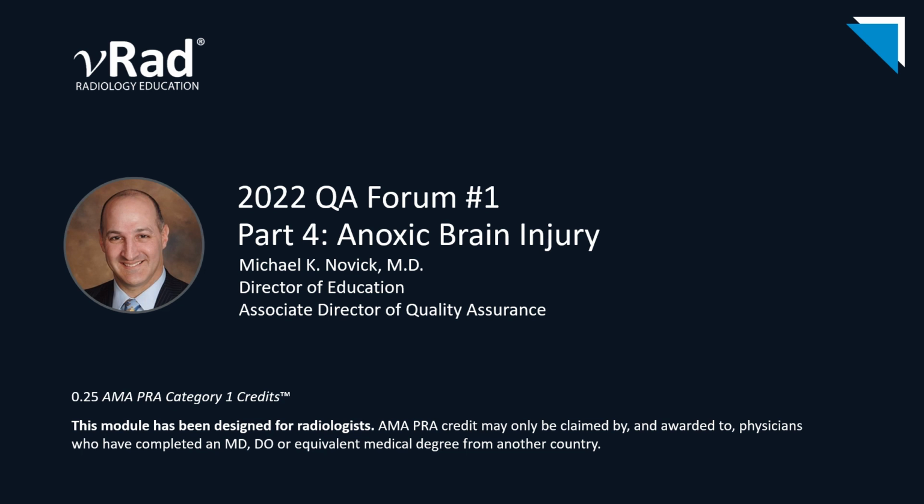Today we're going to discuss anoxic brain injury or hypoxic ischemic encephalopathy or global hypoxic ischemic injury. This entity goes by several names and is one we see frequently during our QA review process.